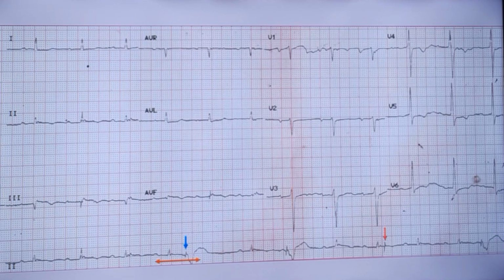Another possible explanation is ventricular refractory period, but with this PR interval, if this P wave gets conducted, it should come as a QRS here. That has not occurred. So this is most probably interference AV dissociation due to the retrograde conduction of the QRS. Then the pause is there. Then the sinus cycle, you are seeing the regular sinus beat with a prolonged PR interval. Then there is another beat here.